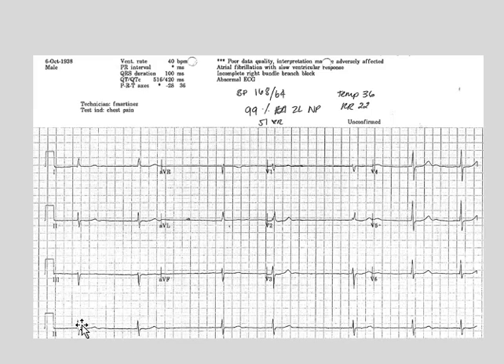And here, because I'm looking for atrial fibrillation in every one, I immediately pick this up. There are irregular beats with no discernible P waves paired with a QRS complex. Atrial fibrillation with a slow AF. And not to be distracted by that, you can't tell without your calipers, but there's a little slightly wide RSR pattern here, and it's diagnosed as an incomplete right bundle branch block. Happy with that.